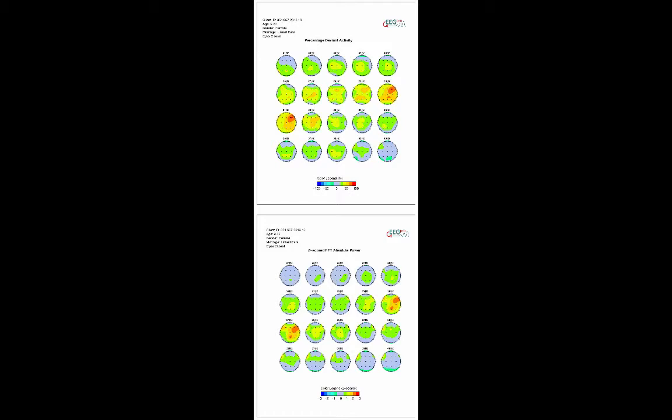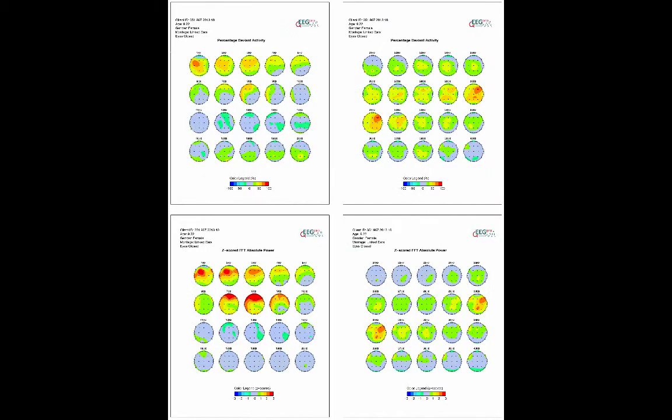When the results of the lower frequencies are evaluated, a different pattern can be seen. Even though the average z-score is very high in the absolute power results around 8 Hz at frontal electrode sites, this deviancy is only present in 50% of the recording. This result can be caused by several phenomena. For example, the power around 8 Hz can be normal during 50% of the recording, but in the other 50% it is deviant enough to cause the average z-score to be very high.